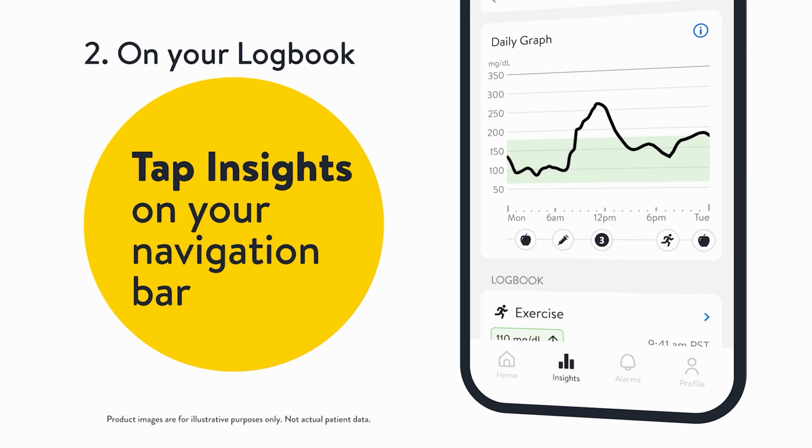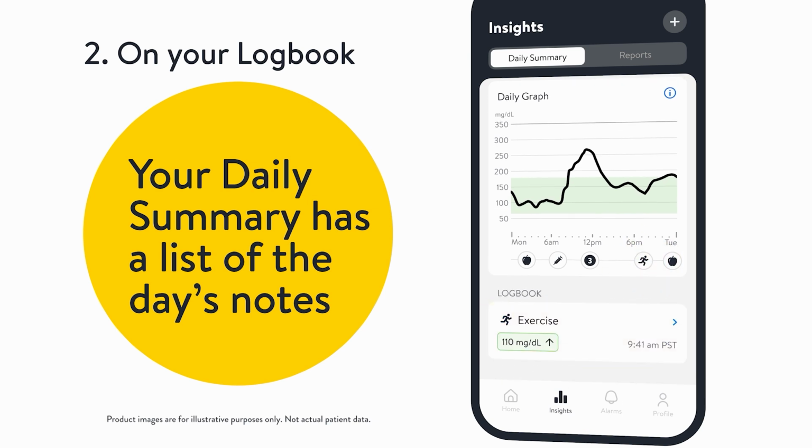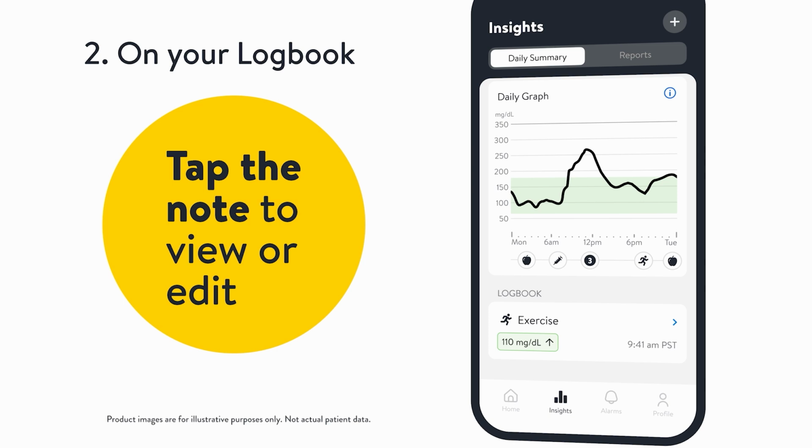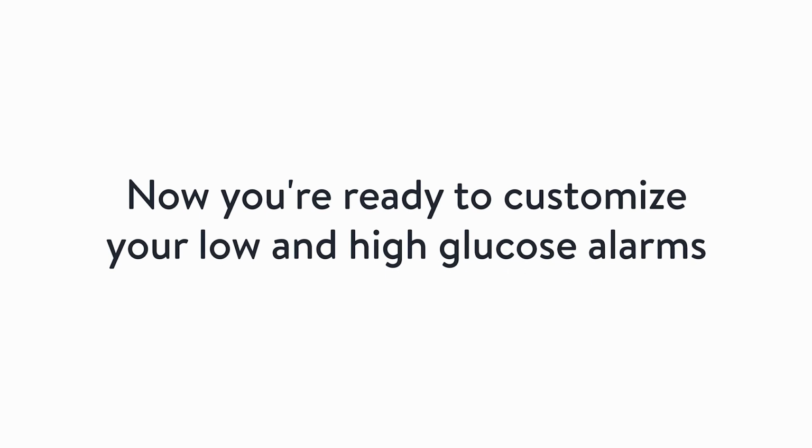Tap Insights on your navigation bar. Your daily summary has a list of the day's notes. Tap the note to view or edit. It's that easy. Now you're ready to customize your low and high glucose alarms.